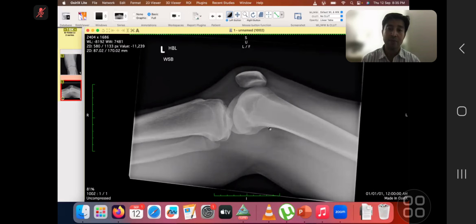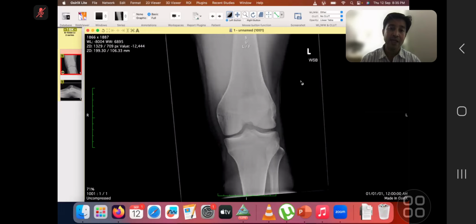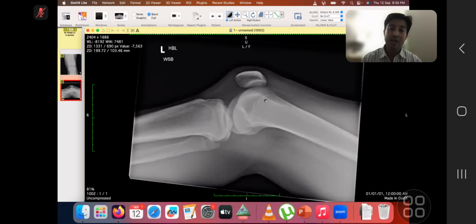The patient had history of trauma. You have to ask for a lateral view, which you didn't. Any AP view, always say that I want to look for lateral before you go for higher modalities. On the lateral view, there is nothing much seen, but you need to still ask. There is no joint effusion. You need to mention that, which you already did.